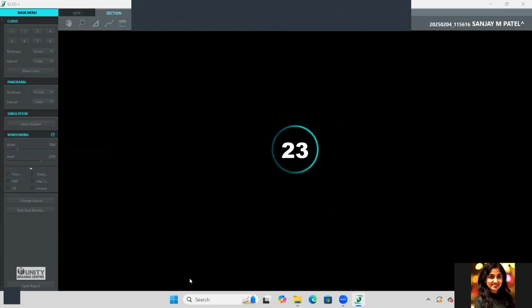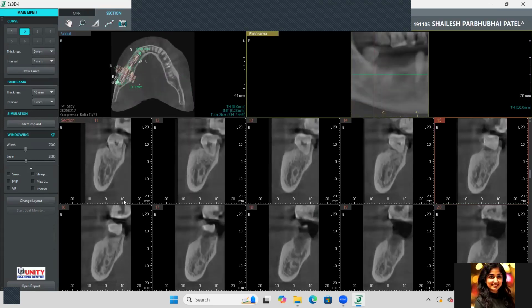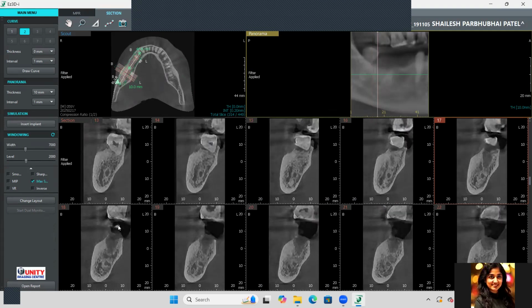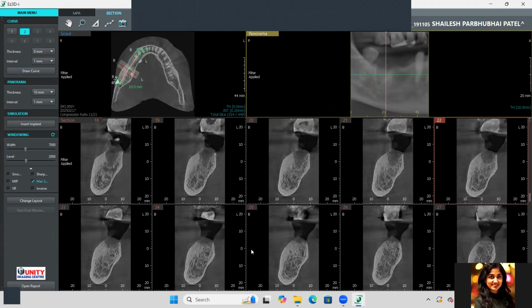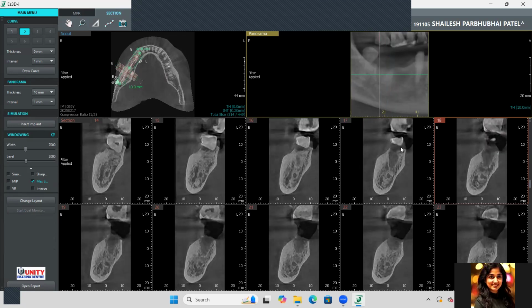We can also see healing lesions before placing an implant. We can take CBCT in doubtful cases, and we can see whether the bone has completely formed or not. This is also visible in IOPA, but as you can see, CBCT is more precise. It is showing this socket.